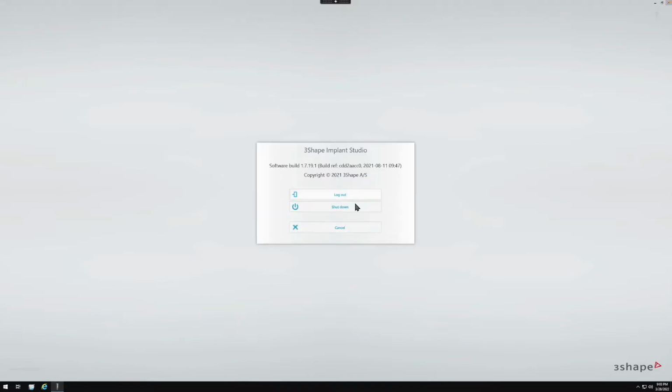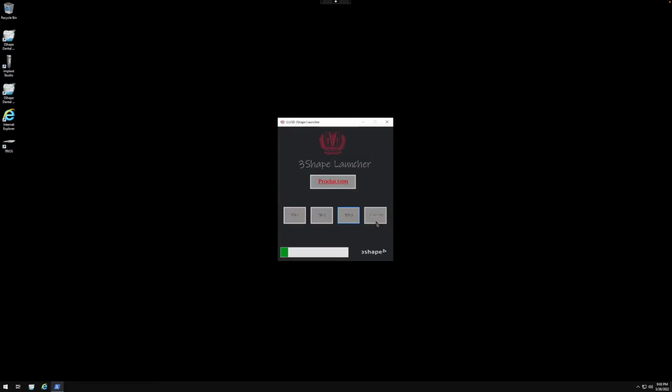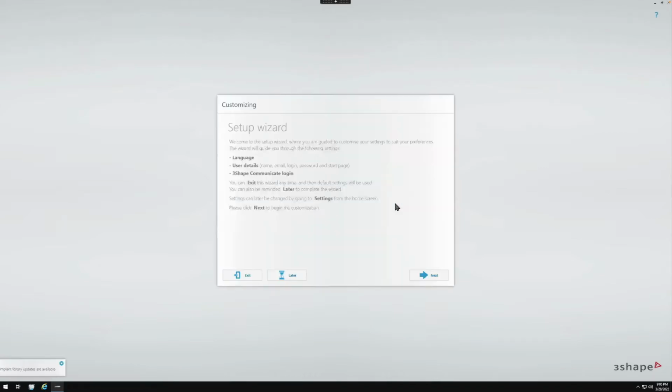All right, I think I have my cases in TR4, so I'm going to go and do that. Click on that server. We'll wait for it to load. All right, if you get this warning, it's fine. Just click OK. Same thing here, it doesn't matter, just hit OK.